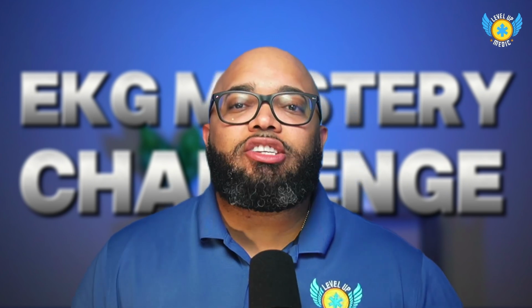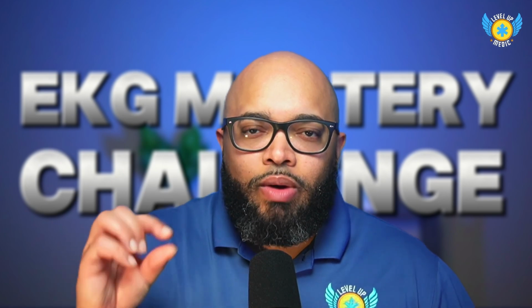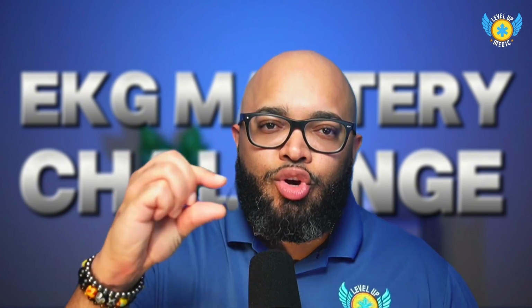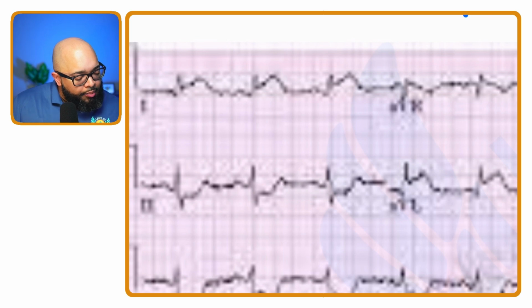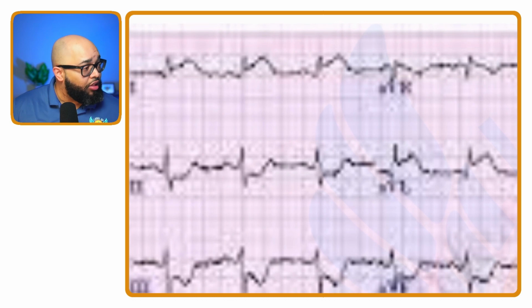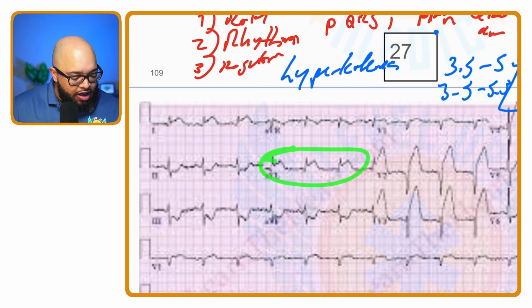Now, how much elevation do you need to classify it as a STEMI? We generally want to see about 2. Some books will say 1 millimeter, but for sure, if we have 2 millimeters, that's 2 tiny little boxes, it's a STEMI. But I see elevation here in lead 1. Now let's look at AVL. So AVL is going to be here.